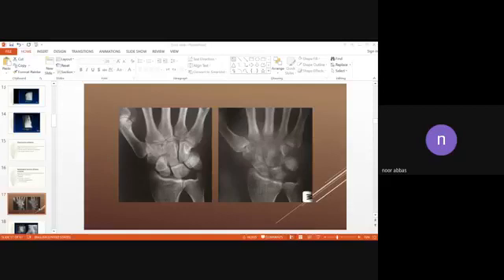This X-ray is showing an example of septic arthritis of the intercarpal and the carpometacarpal joints, basically the carpometacarpal joints. You see here, this is the normal joint space. This is essentially a single joint because it shares a single synovial cavity. So you see here the bone cortex, you can see the joint line. This is the normal state. Look here and you definitely don't see the joint line, and you see blurring on each side of the joint. You don't see the cortical margin because there is bone destruction. You can also observe the faint haziness surrounding the bone from soft tissue inflammatory changes.